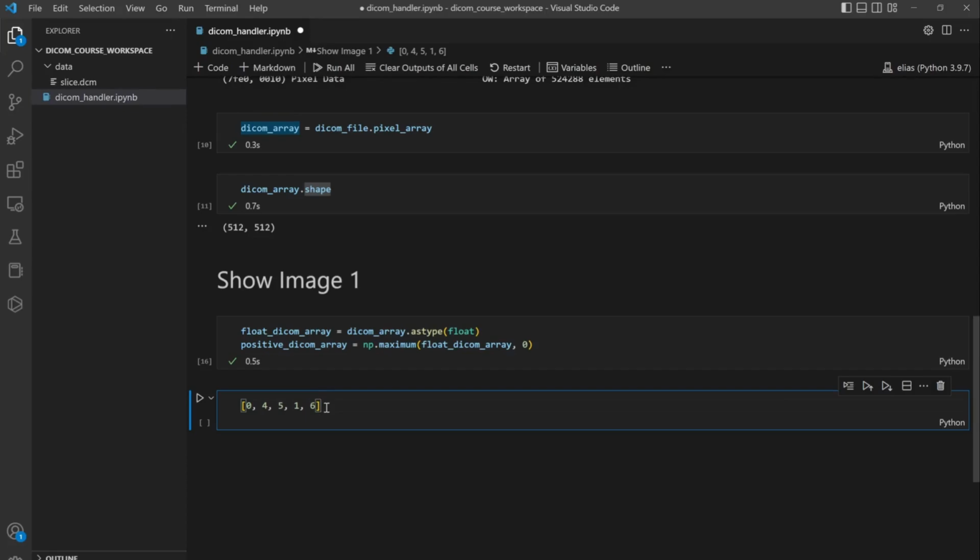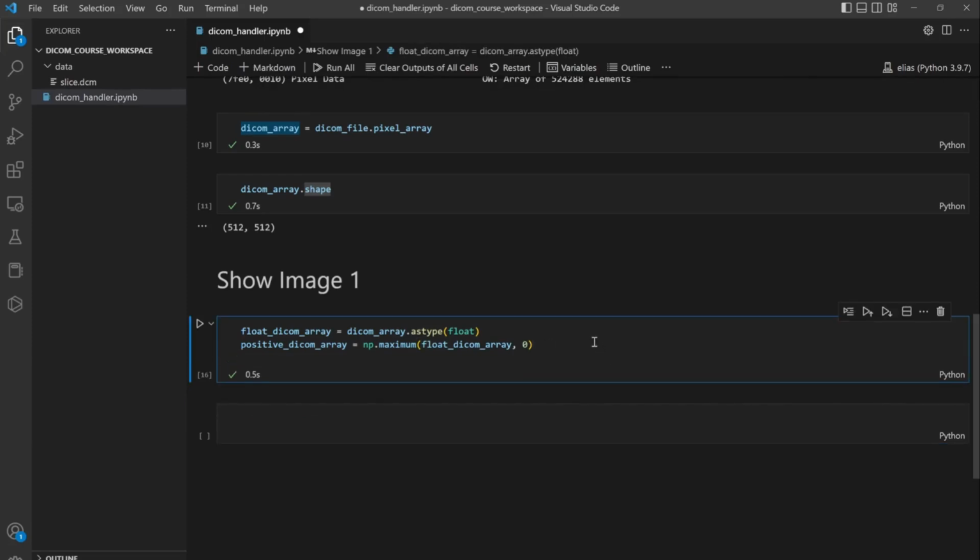And everything less than that will be between 0 and 1, because it is not bigger than the maximum. This is how it happens when we do the normalization. So we'll do the same thing here. Let's give it another variable. As I said, we can put everything in one line, but I am dividing it like this so that we understand the steps. So, normalized DICOM array.